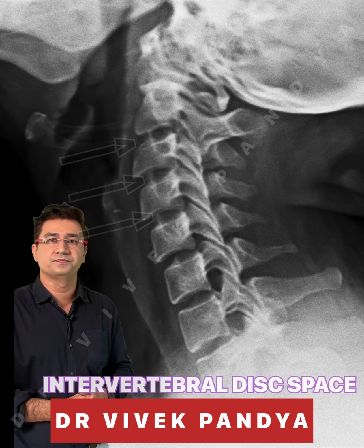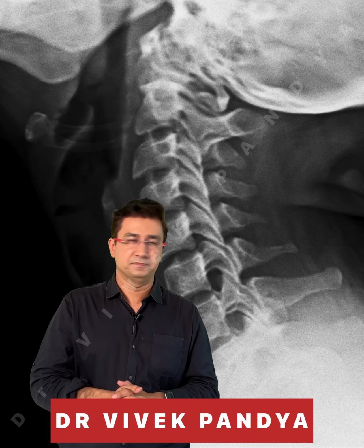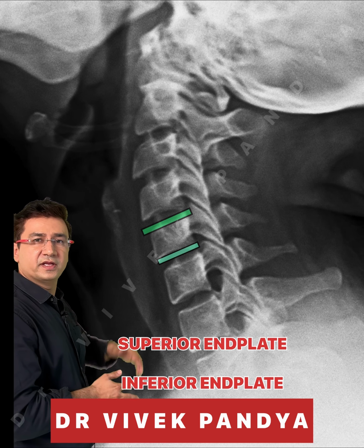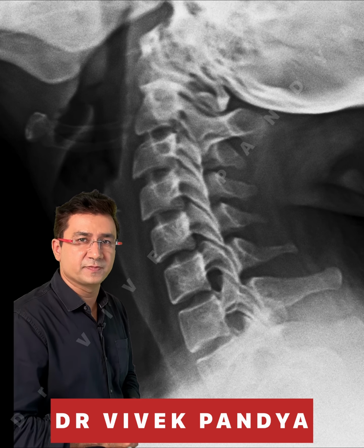Then let's come to the intervertebral disc spaces. So intervertebral disc spaces are the spaces between the vertebrae of the spine. Then next come the superior and inferior end plates of the cervical vertebra, as you can see here, which are very important while reporting a cervical spine X-ray.